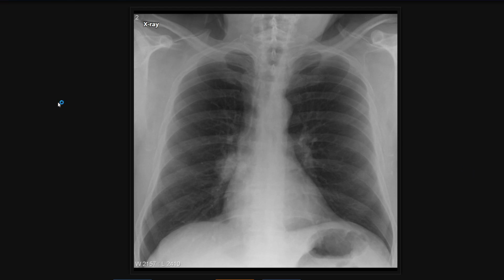Of course, the abnormal finding that can be seen here is that there is a rounded ossified lesion present within the right hilum of the right lung field. What that means is that this might more than likely be a cause of a solitary pulmonary nodule. And of course, if there's a solitary pulmonary nodule, you might think it's benign or you might think it's malignant.